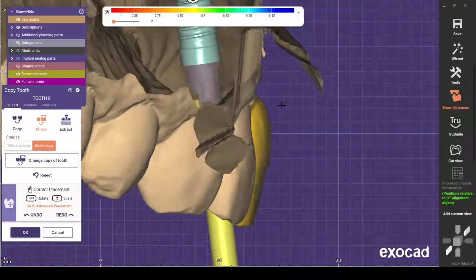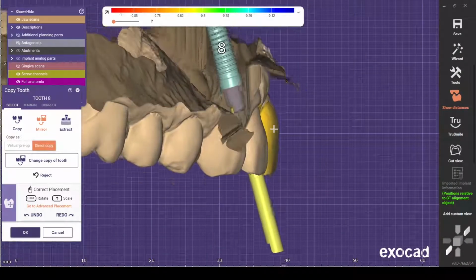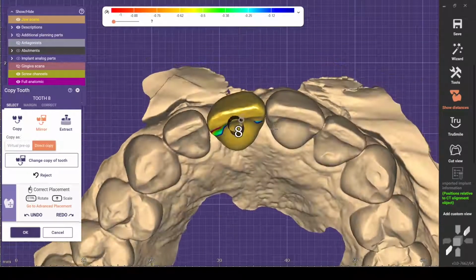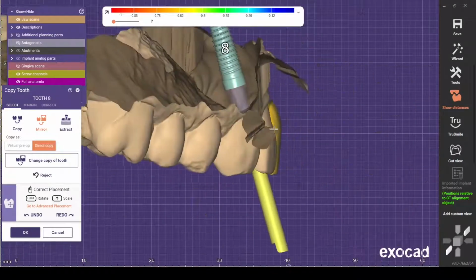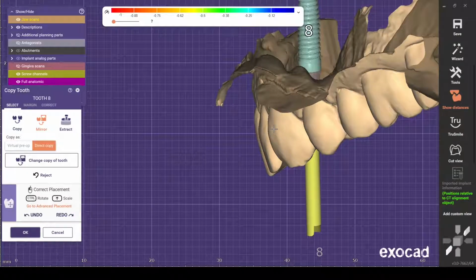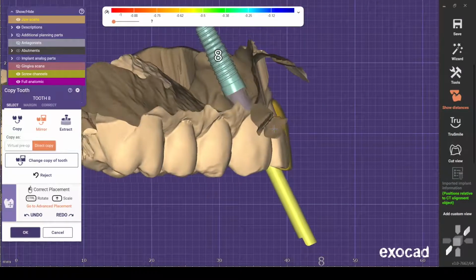I got lucky. I know I'm kind of zoomed in there. I think we're rotated. See how there it looks good, but here it really looks like it sticks out a lot. Is that normal compared to the other side? It's always helpful to do. I guess maybe that is normal.